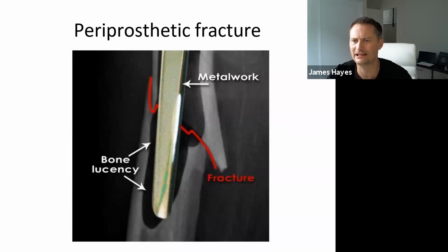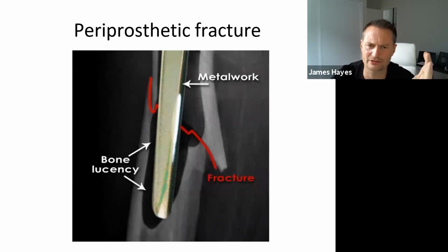And again, here you can see these are the peri-prosthetic fractures. They're horrible things when you see them. So this is a femur. This person has, the yellow thing is the total hip replacement, and they may have jumped over a wall or something. They shouldn't have been. The orthopedic surgeon should have said, hey, look, now that we've put this in, no more jumping over walls. But whatever they've done, they've brought in a huge impact, and the metalwork won't break, so it'll smash and splinter the bone around it. And that's getting quite hard to fix at this stage because you're already missing the joint up north.